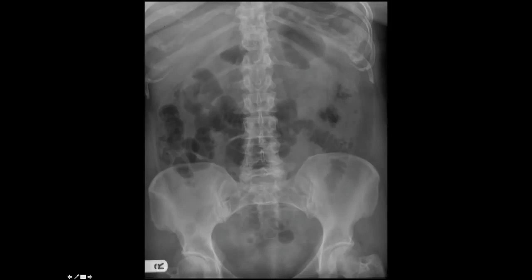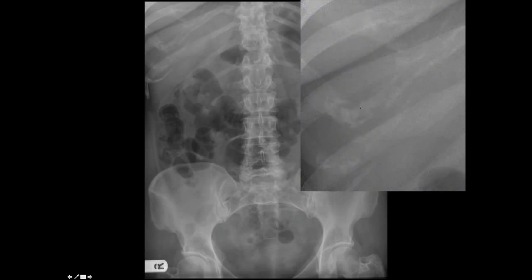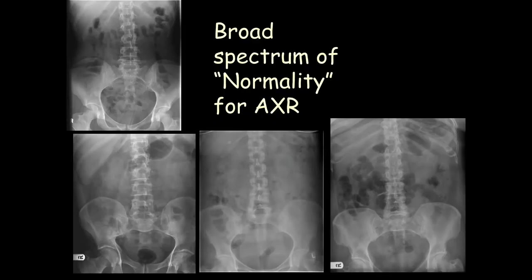And in the additional opacities or calcification, if you look at these areas, these are just calcification in the costal cartilages. Oh, yeah. And again, it's normal, and they're entirely normal. And do they get more common as you get older? That's right, yeah. Okay, so another normal one. So we have done a range of, a couple of normal abdominal X-rays, and we will now see some pathologies.